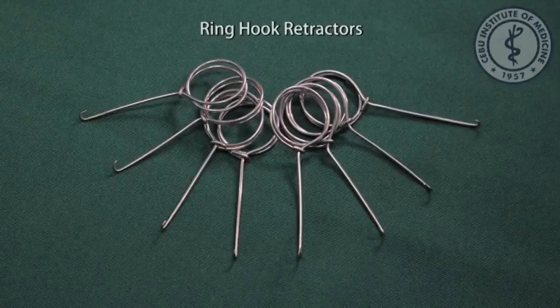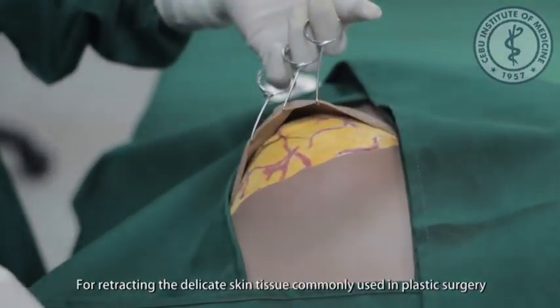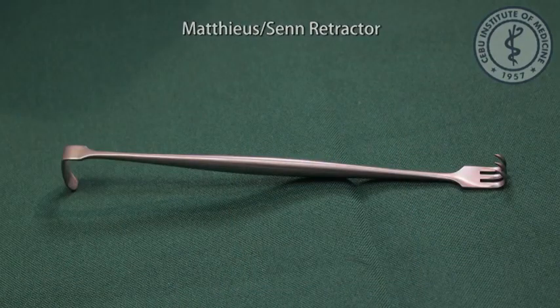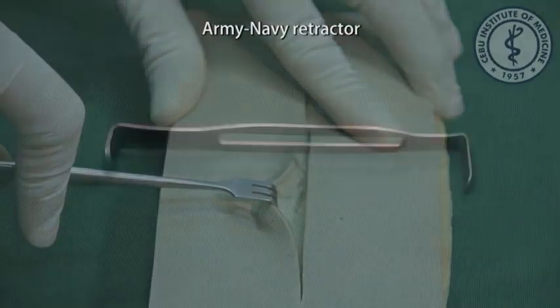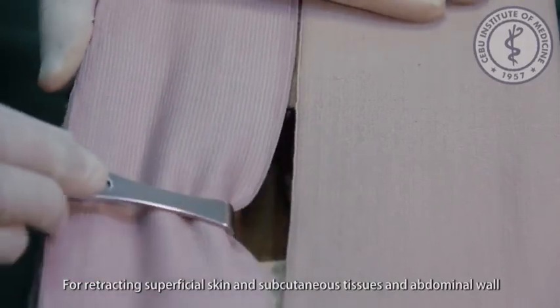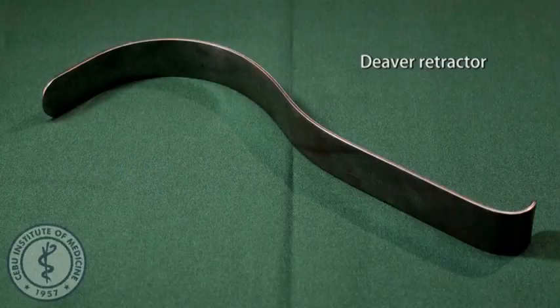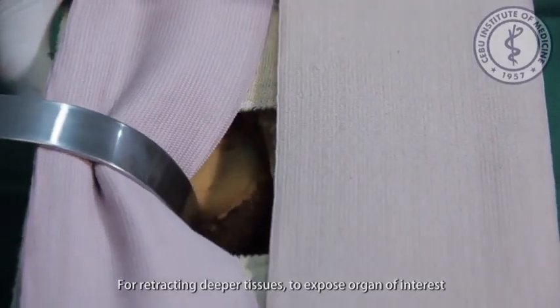Retractors. Ring hook retractors, for retracting the delicate skin tissue, commonly used in plastic surgery. Matthews or Senn retractor, for retracting superficial skin. Army-Navy retractor, for retracting superficial skin and subcutaneous tissues and abdominal wall. Richardson retractor, for retracting muscle tissue. Deaver retractor, for retracting deeper tissues to expose the organ of interest.